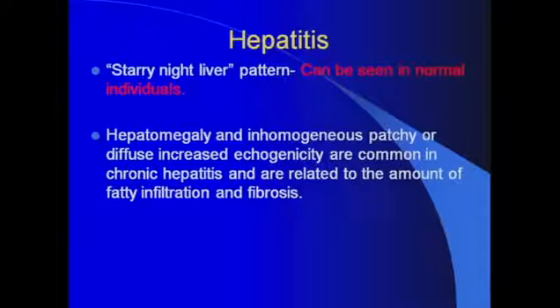One point that really helps you pinpoint that the problem is related to hepatitis rather than infectious acute cholecystitis is to look at the lumen of the gallbladder, as we can see on the next slides.